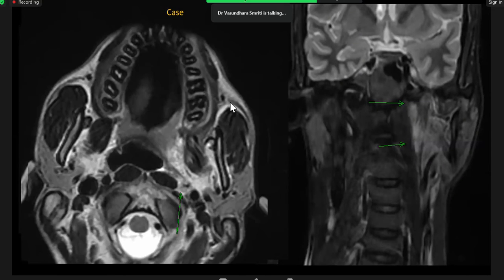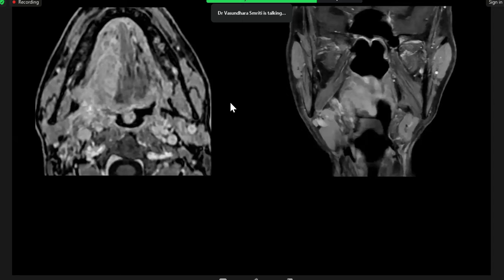So what do you look for? Your tongue carcinomas, where do you look? So the lingual nerve, I have told you where to look. And how about the hypoglossal? I would like to check for perineural spread on the hypoglossal medial to the styloglossus muscle.